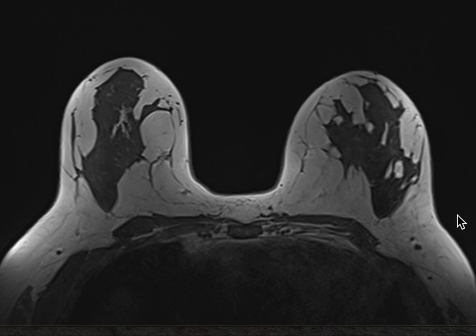This case is from Radiopaedia. It's a dense breasts normal case. I just chose it to show you what's what. I will look at the scouts first, and then I will look at the T1 non-fat sat. This is just the order it comes over to me. Whatever order it comes over to you is probably a good order to look at it in. The order it comes to me is the T1 non-fat sat, and you know that's non-fat sat because the fat here is bright.